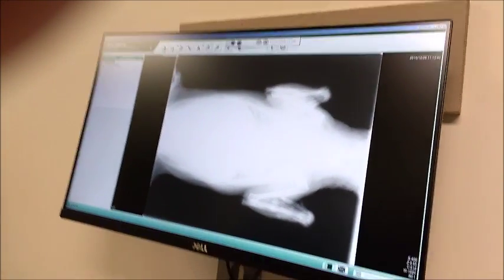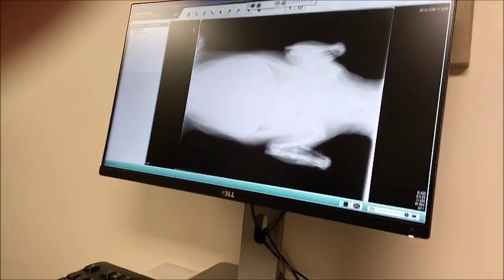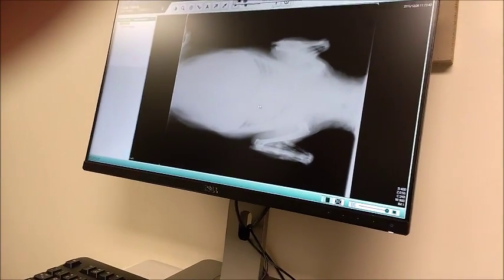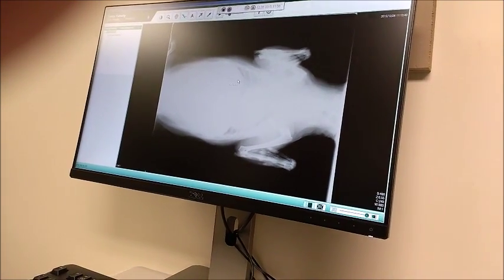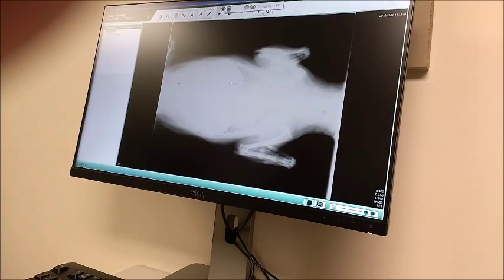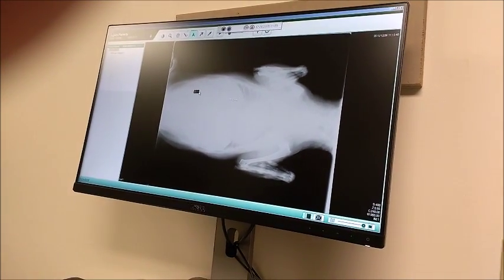Similar, it doesn't have as many tools, but they can do window level, just like we did. She has all these different little things. They can even do a measurement. Yeah, they can measure a line. They can put annotations on, text annotations. Okay, I get it.